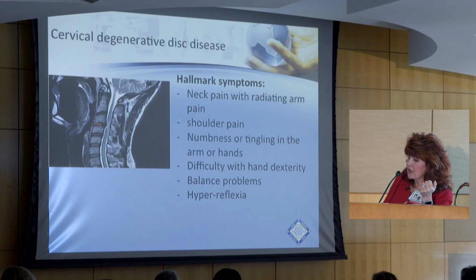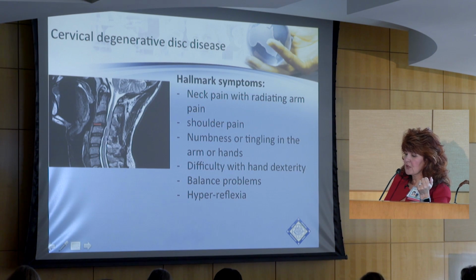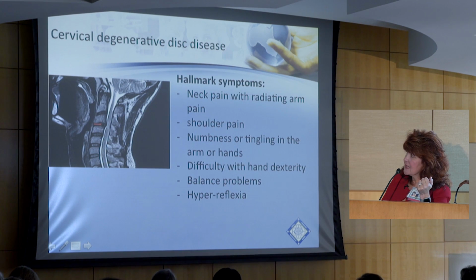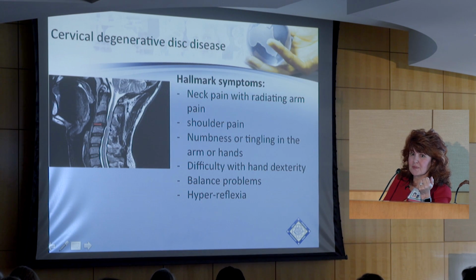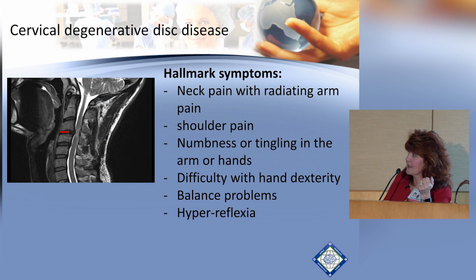And so what you want to look for in imaging studies is the alignment of the bones and also whether or not there are discs that are pushing and also osteophytes in the back that are pinching. And so what you see here is a big disc osteophyte complex. Do you guys see that here? And this tight spinal cord. So here's the spinal cord running down, and you see how it kind of pinches here and then keeps going, and there's almost like a white look to the spinal cord there. So that's spinal stenosis at that level.